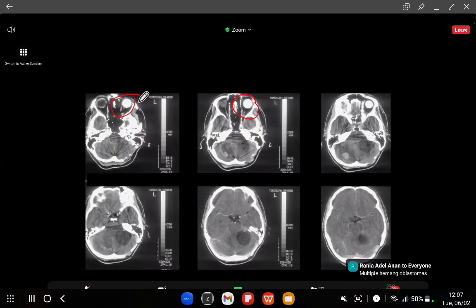Yeah, retinal vascular malformations, whether they be angiomas, hemangiomas, whatever. So the patient's had a prosthetic eye due to retinal pathology, and they've got this cerebellar hemangioblastoma with a mural nodule which is enhancing, but without too much in the way of a cyst. There is a small cyst just here. Von Hippel-Lindau syndrome.